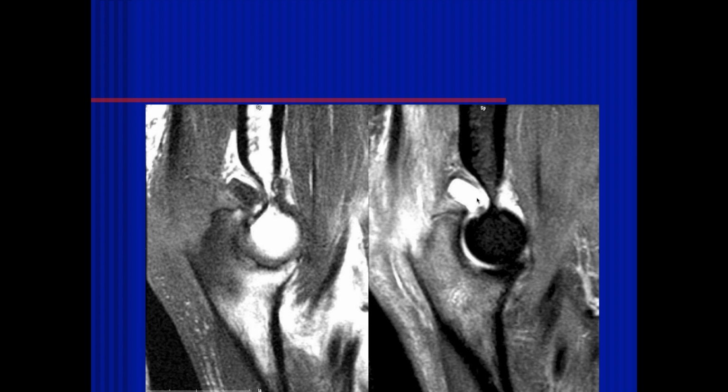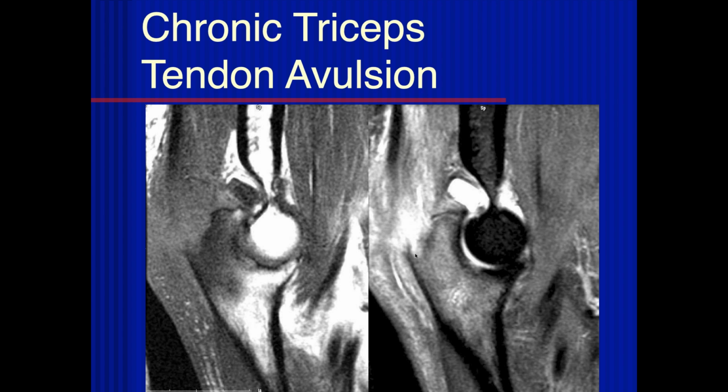Well, I think it's hard to detect without an MR. Right, so this looks like another complete tear of the triceps, and there is cortical irregularity along the olecranon. I don't see the ossific fragment, but I think this is concerning for an avulsion. Erosive change there, but you can see all the sclerosis.